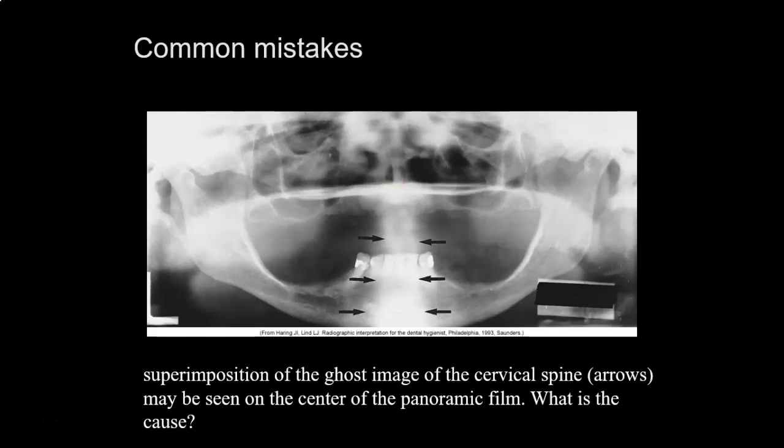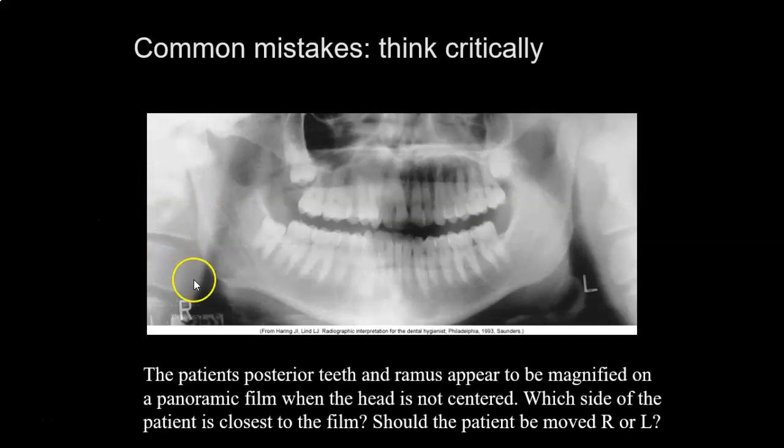That is because the patient slouched in the machine, so they did not stand up nice and straight and tall, with their feet kind of forward. They almost lean back a little bit, you'll see when we demo it. So they didn't stand up straight and get the spine out of the way.